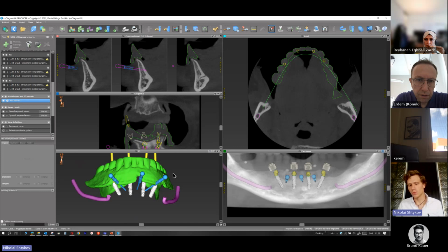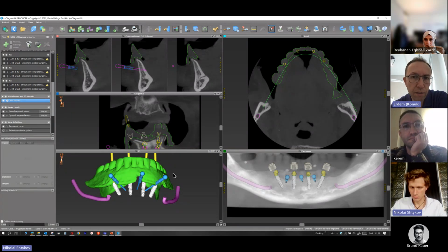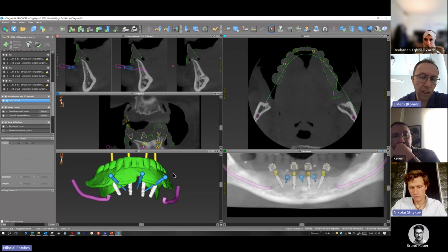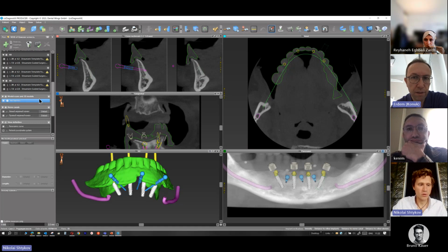Do you know how to combine CBCT or STL? Do you need to see it or not? Actually, Nikolai, we are working with Gökhan. He supports us for combining the files and the guide design. So you can show it, because we are recording this training for Gökhan also. It will stay in the recording so we can watch it again with Gökhan. Okay, I will show it.